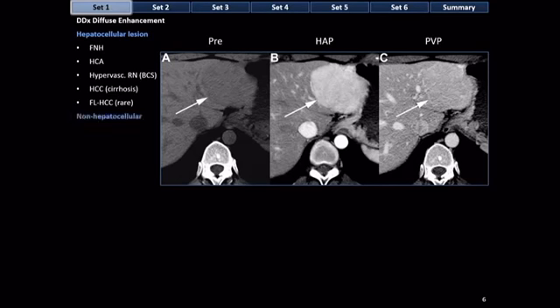and very rarely in the setting of non-cirrhosis, fibrolamellar HCC. Now, occasionally, diffusely enhancing masses are not hepatocellular, and the differential includes small, rapidly enhancing hemangiomas and small so-called hypervascular metastases. So hemangiomas that are up to about 15 millimeters can enhance homogeneously. Once they get bigger than 15 millimeters, they very rarely enhance homogeneously.